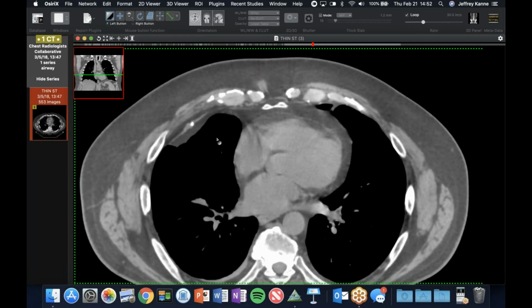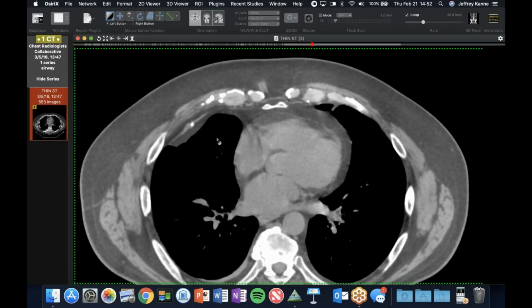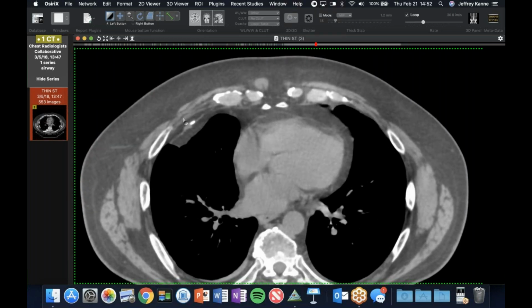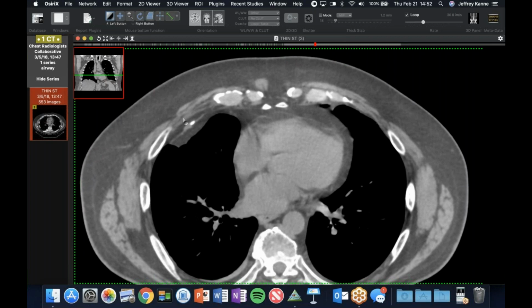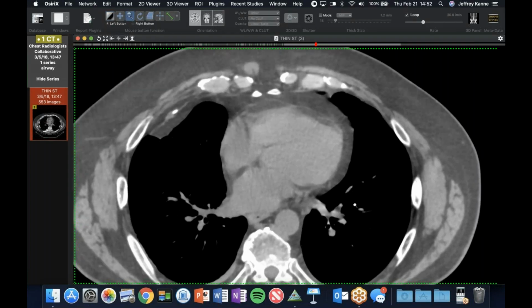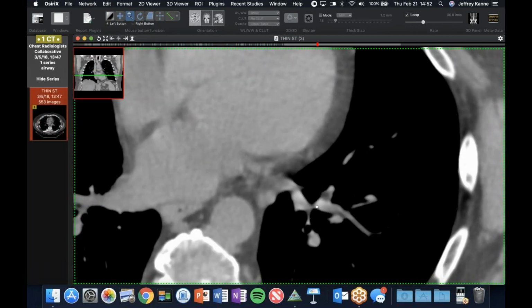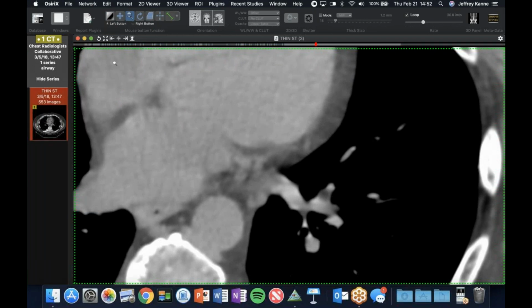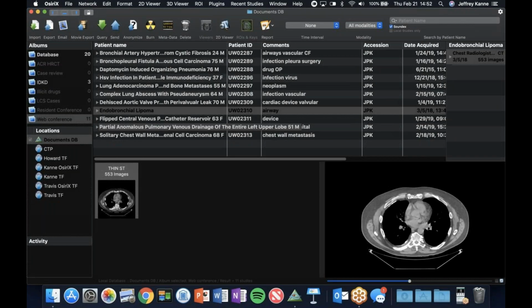They're described, and this is only the second one I've ever seen, but I'm presuming that's what it is, given that it's been there for years and it's always in the same place, not a big aspirated fat blob. The other thing is it doesn't look like fat in a hamartoma, because it doesn't look as if it's part of a mass. It looks as if the whole thing is fat. Right, exactly. In hamartomas you usually see other tissue mixed in, and this is very bland. If I zoom in, you can see it's really homogeneous. So it's a presumed endobronchial lipoma.